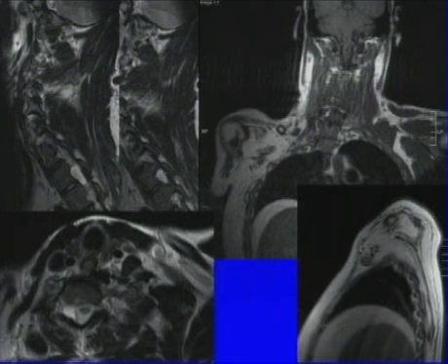This is another patient, a 31-year-old, who had a long history of previous trauma with subsequent development of a brachial plexopathy. So if we look at the sagittal T2 weighted images from the patient's cervical spine, we can see marked enlargement of the neural foramen. And again, don't really see any nerve roots coursing through the neural foramen. If we look below, we get the hint that there are nerve roots coursing through. If we look at the axial image, again, no nerve roots, pseudomeningocele formation.